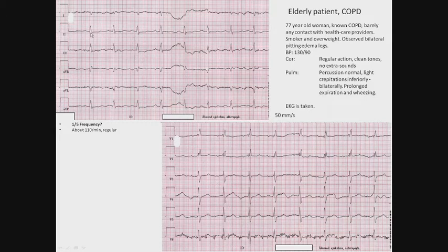And lastly, let's check the QT interval. Let's see if we can find a thick line here. Okay, so 100, 200, 300, a little bit more, 340, 330 milliseconds. Okay. Also, when we think about intervals, we also address conduction.